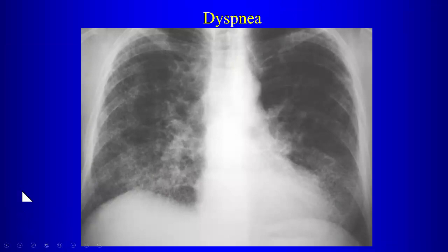Here's another patient who's short of breath. The chest radiograph demonstrates peripheral interstitial opacities, predominantly at the upper lungs or lower lungs? Lower lungs. Yeah, mostly lower lungs, but notice how markedly peripheral this is. You get this kind of L-shaped distribution of the interstitial disease.